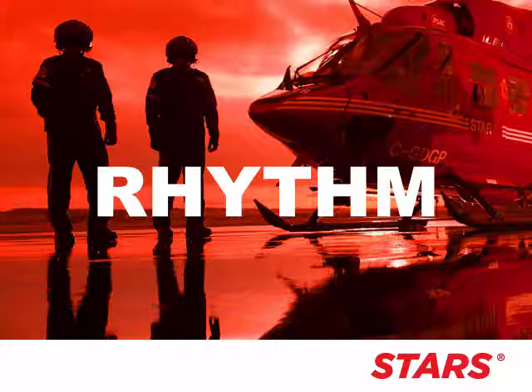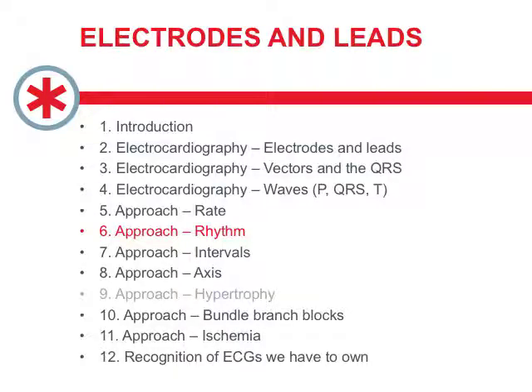In case you can't guess, this is part of the ECG approach on rhythm. As we've talked about in the last lesson, we want to have this really unified approach to our interpretation of our ECGs. The first step, of course, looking at heart rate, and this is going to be talking all about ECG rhythms.